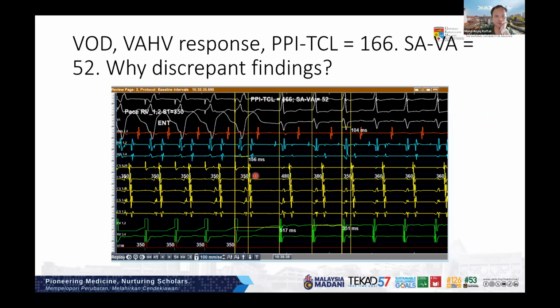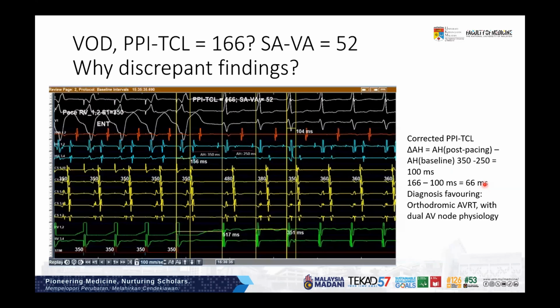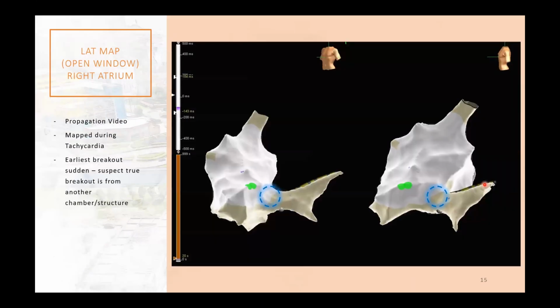Yeah, 156. Yep. One pacing. Yep. Where do you ablate epicardial? I know that's it. Cardiac vein is epicardial, right? All right. So usually, at the MCV origin, the bypass tract has many branches to the atrium, as Dr. Huang mentioned, sometimes to both right atrium and left atrium. So it is good to ablate from the MCV ventricular insertion site, which is best. You can ablate by single burn, but that point is a relatively dangerous area. Could you please comment about that?